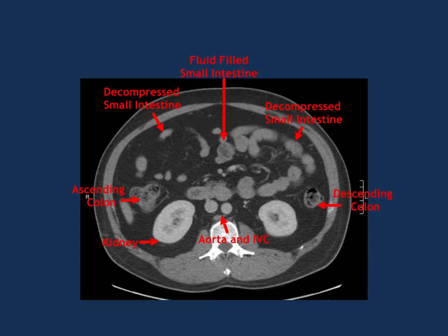That's a small intestine as well, but... Yeah, we have an opportunity to see a fluid-filled loop of bowel. And the way you know that is because you have a rim of enhancing tissue around it. That's the bowel wall, because all the blood is going to the mucosa and submucosa. And in the middle, you've got a fluid-filled loop of bowel.